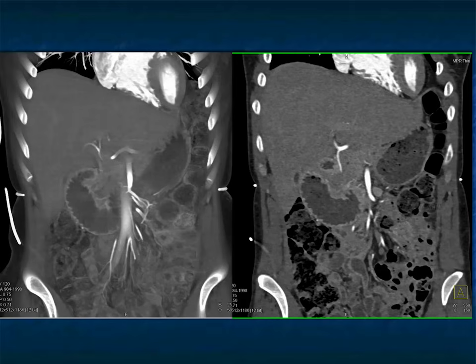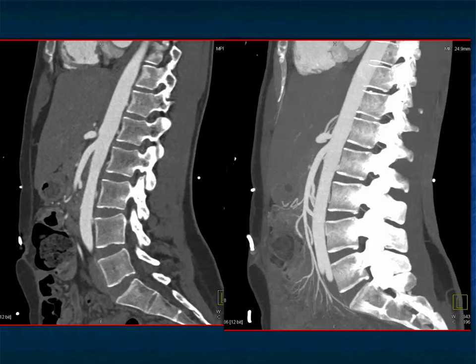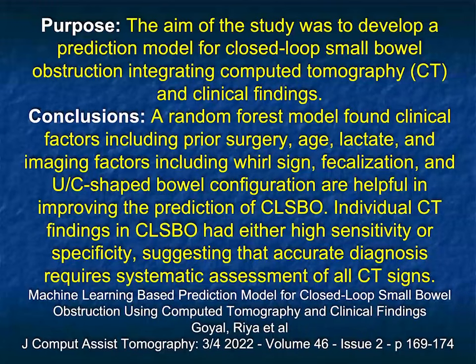And again, as I make the point, if you only see narrowing of the angle, but you don't see dilatation of the duodenum, that is not SMA syndrome. It's simply narrowed angle. I'll mention it, but I'll say that this is not SMA syndrome because the duodenum is not dilated. And that's a very, very important point. And again, if you notice, I've just showed you 5 cases, and all the cases looked very similar to each other. Okay? Really simple.